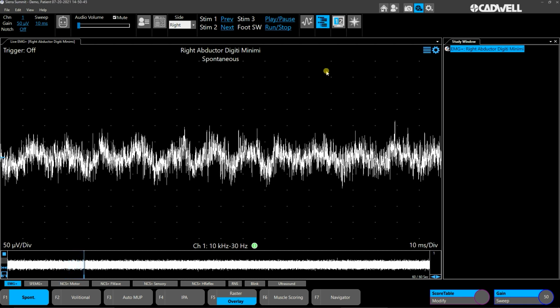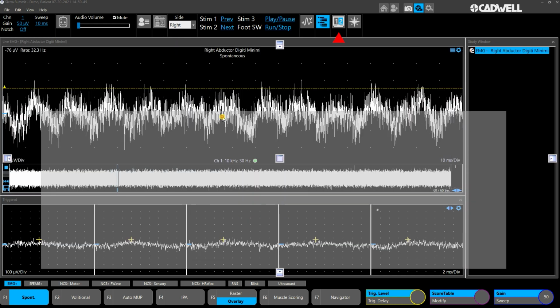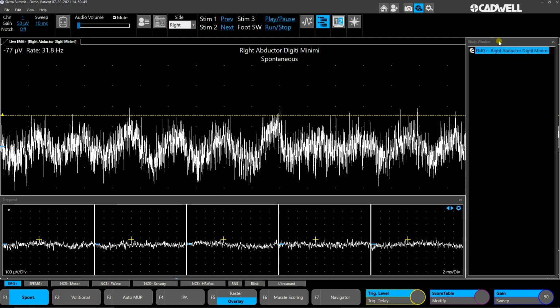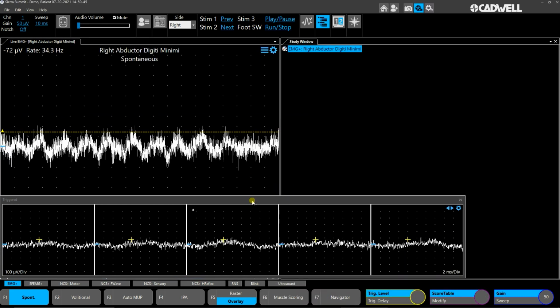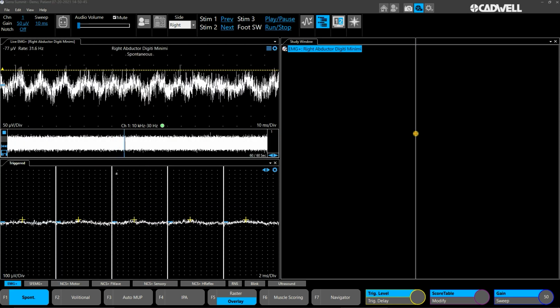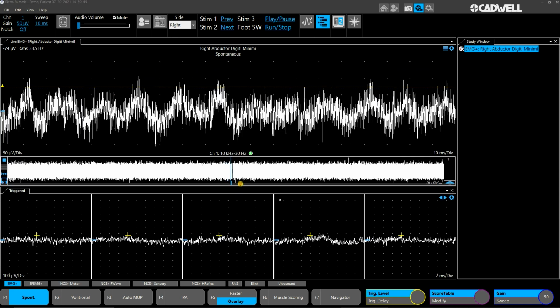And then you can go to View 2 and do the same thing. So in this view, I'm going to make this top window the main docked window, and then I'm going to make this window docked to the right of it, and this window docked to the bottom part of it. And then we can easily adjust how big these are. So this makes it really easy to adjust window size, but also a few other things.